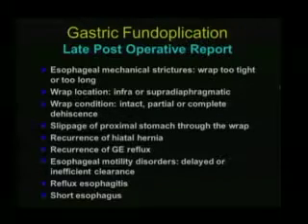Third, we have to mention the condition of the wrap, if it's intact or if there is a dehiscence of the wrap, could be partial or could be complete. It's not always easy to know if it's partial or complete, but in some cases it's possible. Other thing we have to mention in the report, if there is a slippage of the proximal stomach through the wrap. This is one of the most common complications after the surgery.